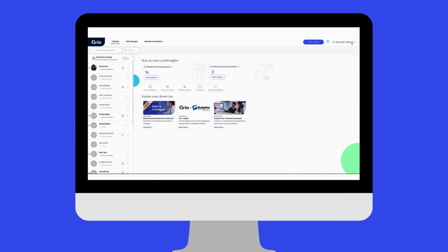In this video, we're going to walk you through the new tool, Grin Automations.